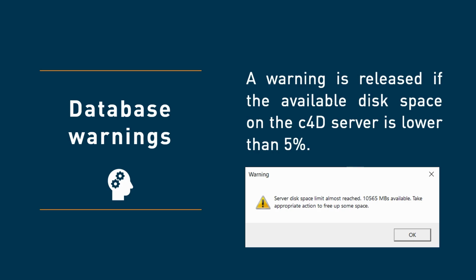This warning appears during the start of the c4D software if the hard disk drive where the c4D database is located has less than 5% space left. Should any of these warnings appear, please notify the responsible person to manage these situations accordingly by archiving patients or providing more disk space. And now to the closed gantry specific changes in c4D 6.13.